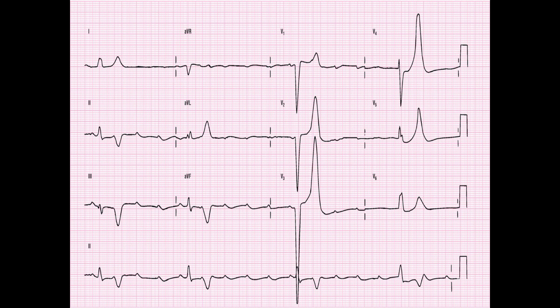Ventricular hypertrophies. We're going to throw that out the window. It's a ventricular, we've got ventricular complexes. We're going to throw that out the window. Atrial enlargements. We don't really need to worry about that right now, do we? Maybe, but is left atrial enlargement really this guy's biggest concern? No. So we're also going to skip over that.